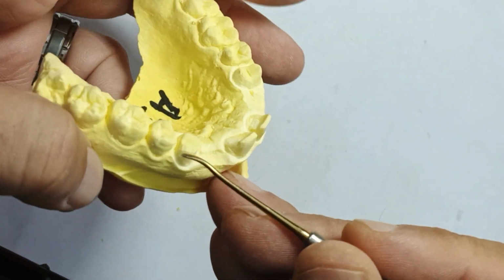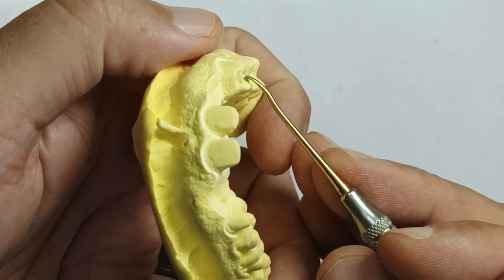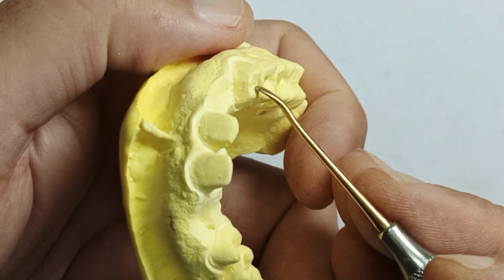This one has a little bit of occlusal dip, but if you see sideways, there is no clearance between this and the second premolar, so there is no occlusal clearance. Now once this crown goes back in or a bridge, they're going to be trimming the opposing tooth, and that will be it. Another one.